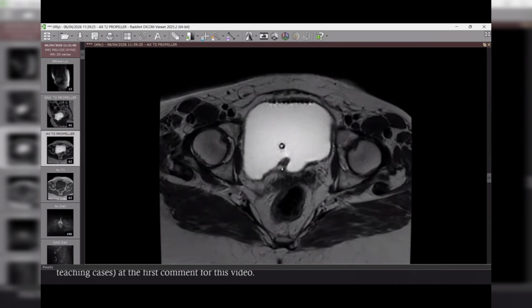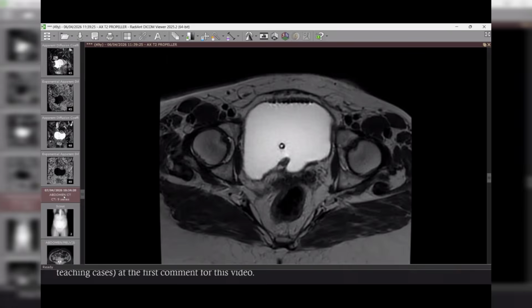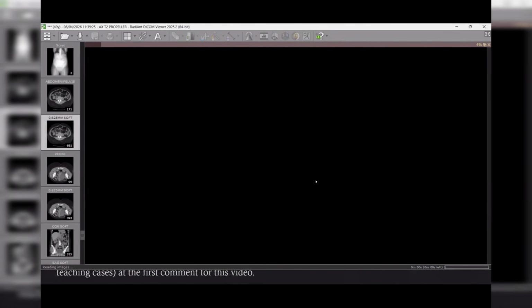So I called the clinician and told him the stone is present inside the intramural portion of the right ureter. He told me no, the right ureter is free. So again, it's a dilemma for me. I did a CT scan for this case, and I found, as you described, a duplex kidney and duplication of the right ureter, as you see here.